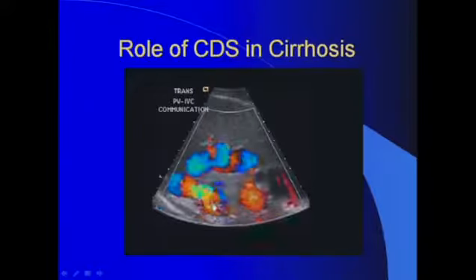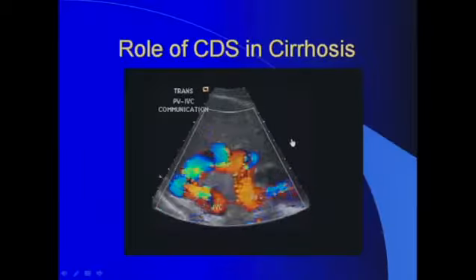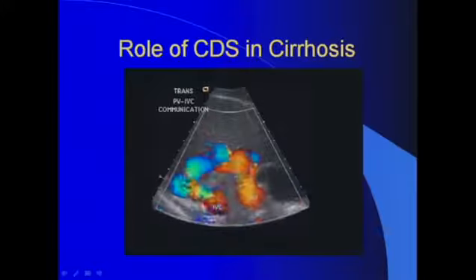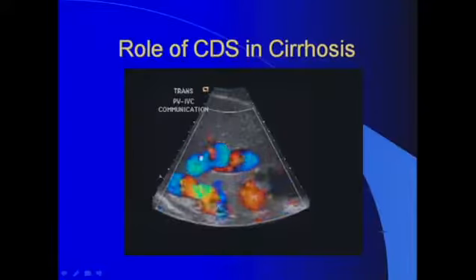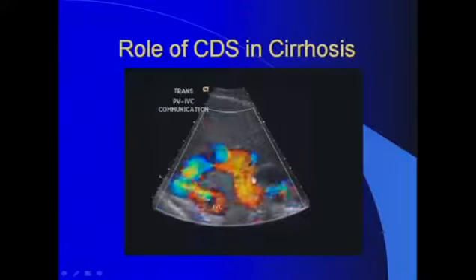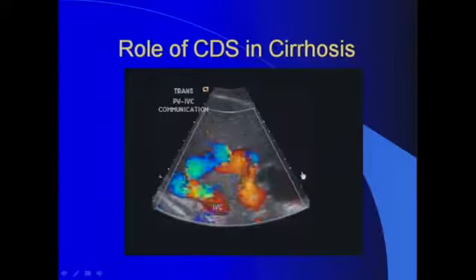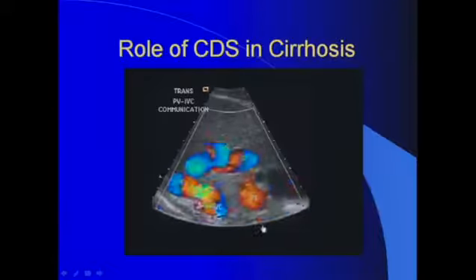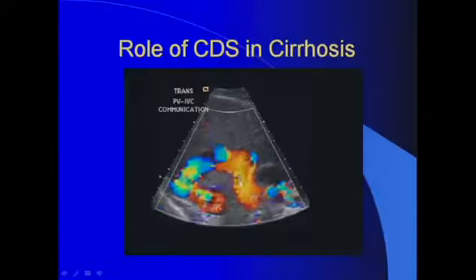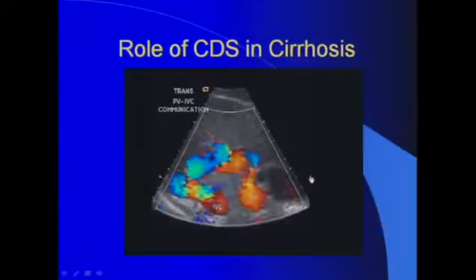So you managed here to avert the possibility for an interventional radiologist to go and create the shunt, as the patient is already having an auto shunt, what I call an auto shunt, and there's no need to intervene to decompress the system. It's already spontaneously decompressed. So expect to see these things occasionally in patients with chronic liver disease, portal hypertension, and cirrhosis. Now, if you evaluate this liver just with grayscale without color Doppler, you're definitely going to miss this significant finding in these patients.